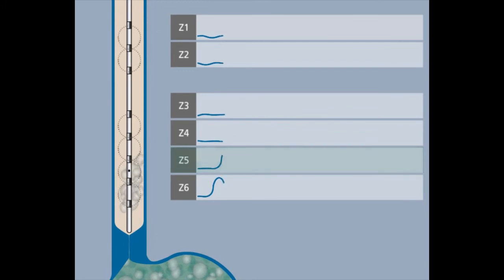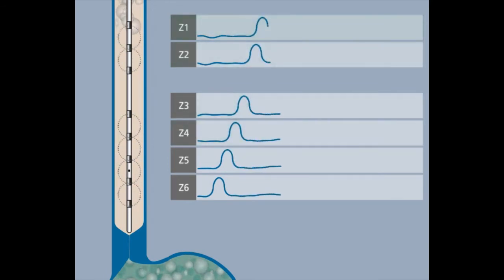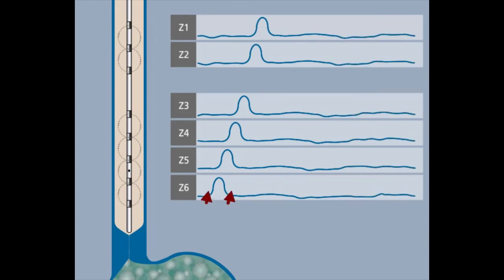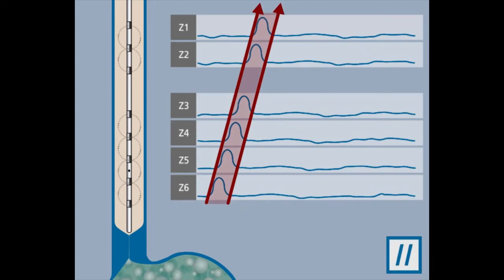When the air moves farther up, the impedance on the channel above will increase. At the distal channel, the impedance level will return to the baseline. This continues. The entry and exit in each segment is depicted by the two lines.